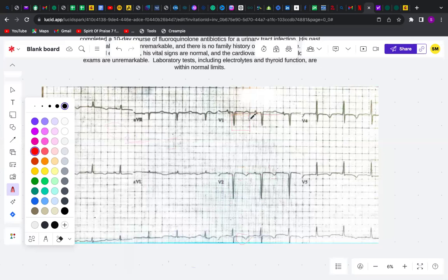Seeing that, I just picked that up, tried to calculate it using the grid. However, there's a formula they use to calculate it, right? And that is called the Bazett's formula. They use the Bazett's formula to calculate what we call the QTc, the corrected QT interval. So we will talk about that in a moment. This was what I also picked up, the prolonged QT going on there.